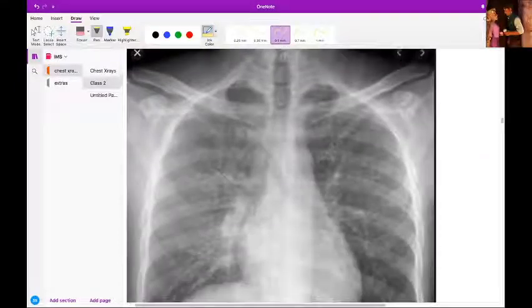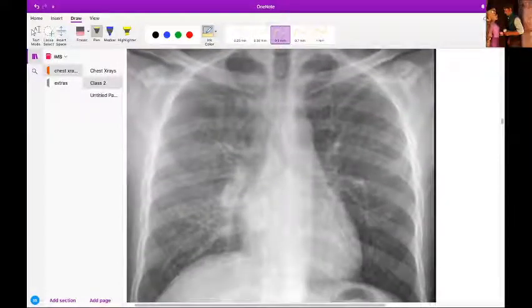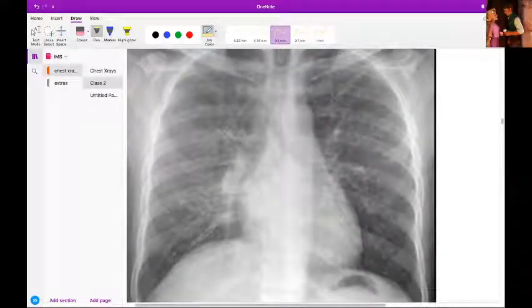Okay, now what is this? What is this X-ray? Anybody?